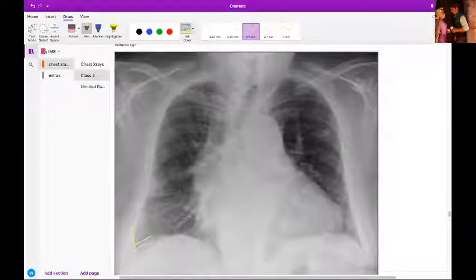Okay. Trachea is shifted, yes. Okay, so trachea is shifted. What is this over here? The aortic knob is enlarged. We'll study that next class. Okay. So yes, the aortic knob is enlarged, and because of the enlargement of the aorta, the trachea is shifted. So what could be the cause of enlarged aorta?